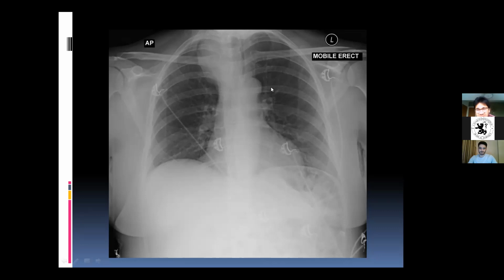Could be a germinoma as well. Very, very rare conditions. I really like this. Always think common is always common. Exactly. Thyroid. That is the most common thing that you will see. Thymomas are very rare. Germinomas are very rare. Anything else you think about is very rare. Common is always common. So in this case, it is a thyroid cancer or thyroid goiter that's causing this deviation to the left.